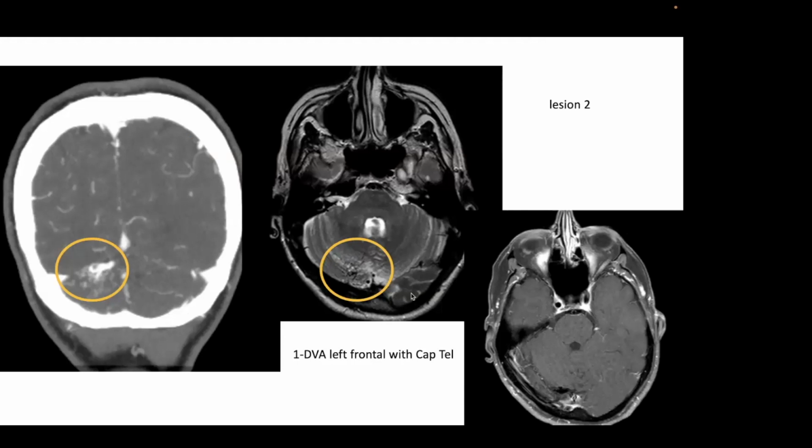Mostly looks like an AVM. There are a lot of small vascular channels, and you get the feeling that these are high velocity vasculature. And we have the cerebellar hemorrhage, right? Yeah, AVM. So this is actually an AVM, dural fistula. This proved to be a dural fistula.